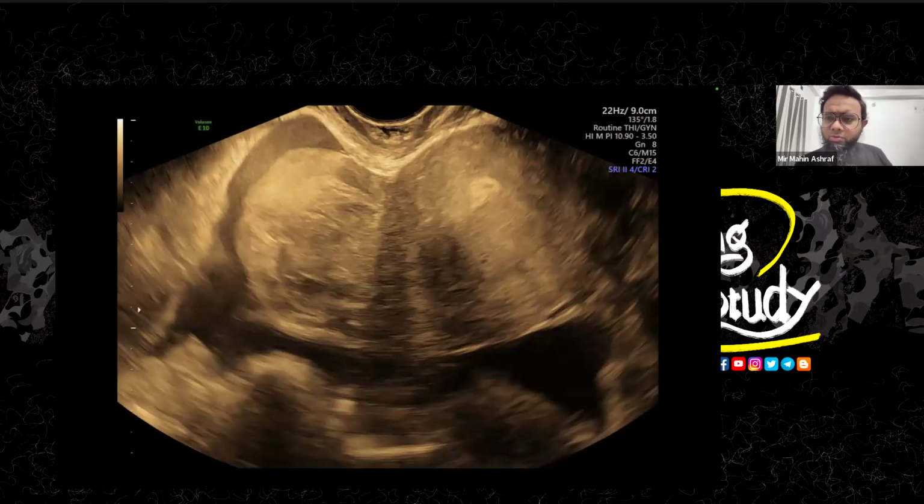I think my abscess was not looking anechoic. It was looking hypoechoic, but I was decreasing the brightness. So whenever I go for the lower abdomen, I try to reduce the brightness or gain to understand the surrounding lesion, surrounding abnormality. So it was not anechoic. It was a little dark. And whenever the abscess gets healed, it gets relatively darker or relatively echogenic, depending on the internal contents. So if you see increased density content within this abscess, then you will see it to be a little bit echogenic.